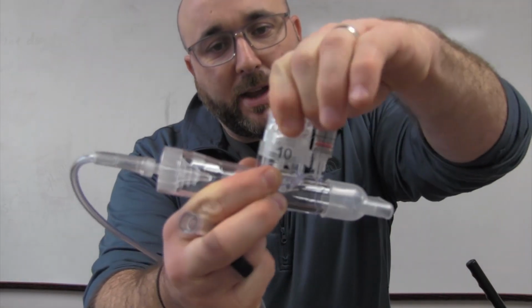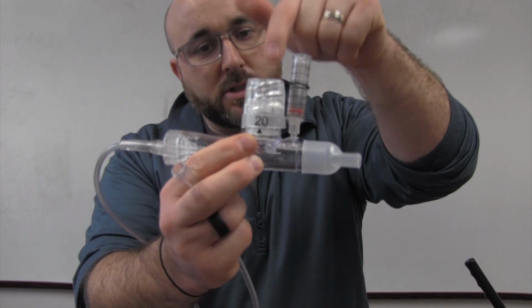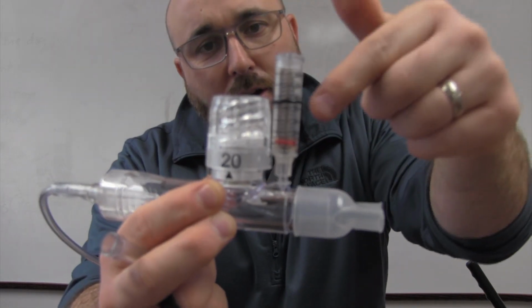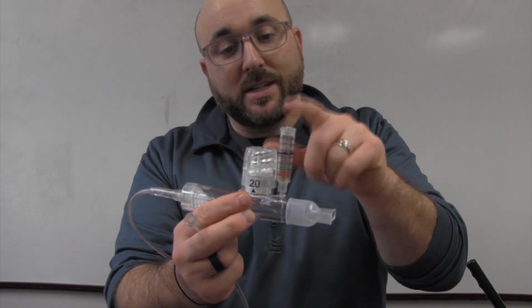So we have 5, 10, 15, and 20. On top of the airflow coming through to the patient, you also are going to have your expiratory resistance here. The manometer is really nice because that's going to show you what the current flow, actually pressure, is coming back to the patient, the combination of the resistance and this flow.